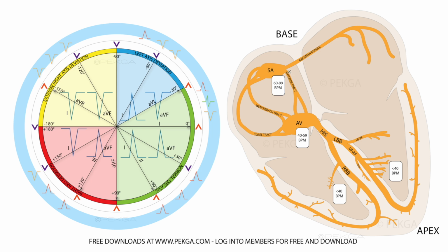But really, in this case, we get one signal, that signal gets blocked. Then we get another signal, and that signal also gets blocked. And then finally, the third signal makes it through, and it starts depolarizing the ventricles in a consistent relationship of 3 Ps to 1 QRS response. So that's what's going on here.